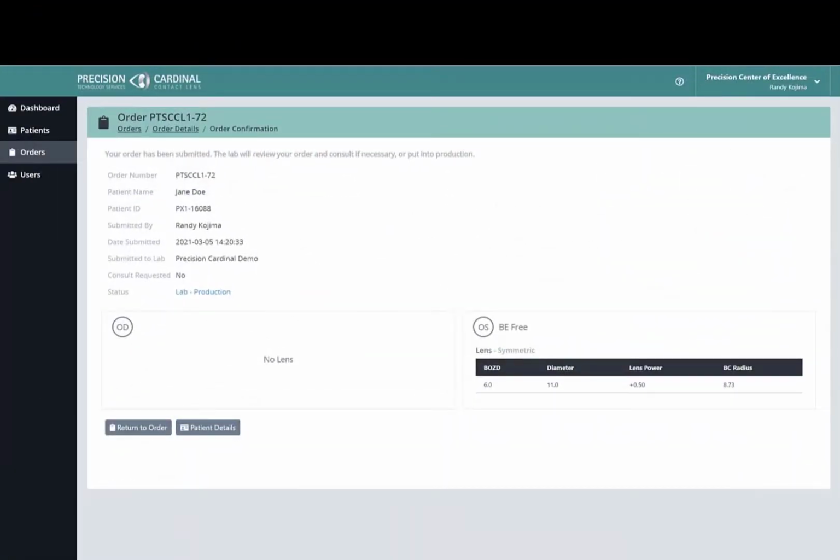The order has been placed. You will also receive an email confirmation, and the lens will be manufactured and sent to you as soon as possible.